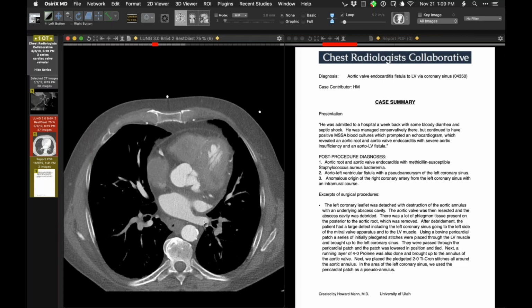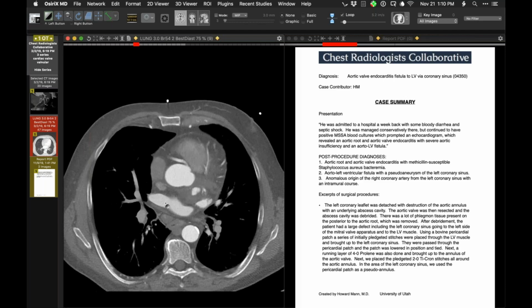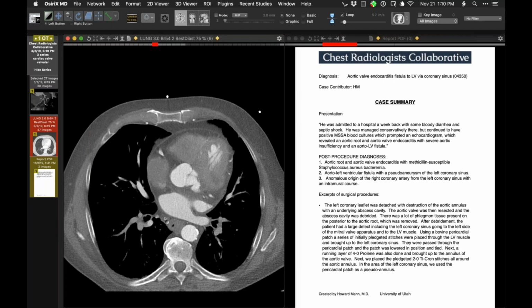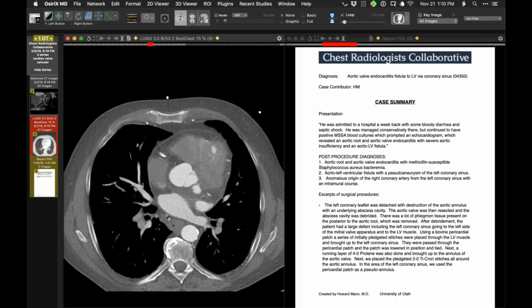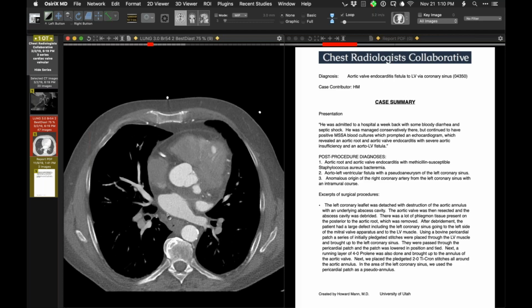Anything about this that doesn't make sense, Travis? It all seems to fit very nicely, Travis and David. Yeah, agree. I think that it looks like it may be involving part of the mitral-aortic intervalvular fibrosa, that portion of the aortic annulus that's the least vascular and the most susceptible to infection or injury. Okay.